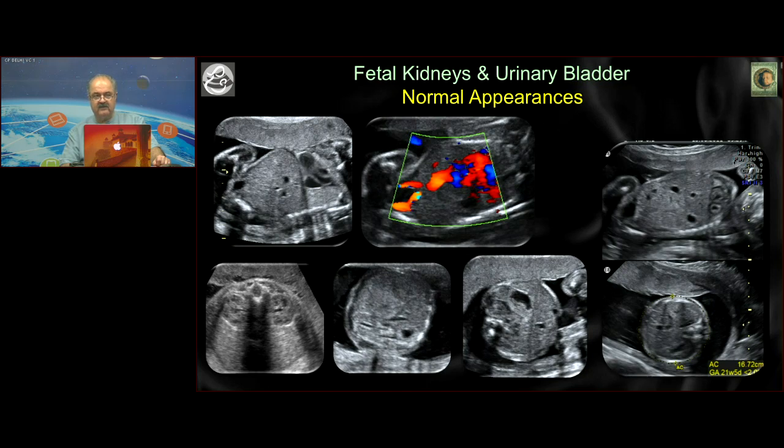Remember that when you look at the thorax and abdomen, you will always like to be sure that it shows a urinary bladder, and therefore you will watch the filling and the emptying of a urinary bladder. You will differentiate from cystic spaces that you see around, including the stomach, the gallbladder, the portal sinus, and so on, and then go on to make sure that yes, indeed, the kidneys are kidneys.